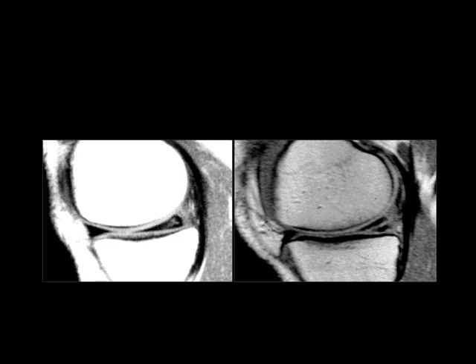And this meniscus is normal or abnormal? Abnormal. Yeah. And you see, the normal meniscus is black in all images. But here, the posterior horn of the medial meniscus has an abnormality. Then, if the abnormality is within the borders of the meniscus, this is degeneration. And if the abnormality cuts the border of the meniscus, this is a tear.